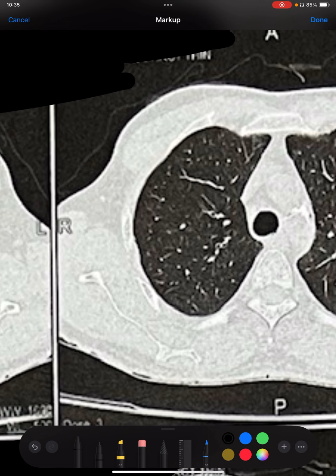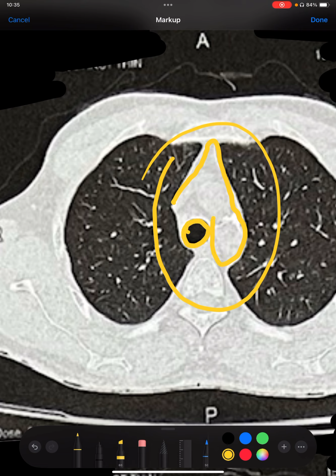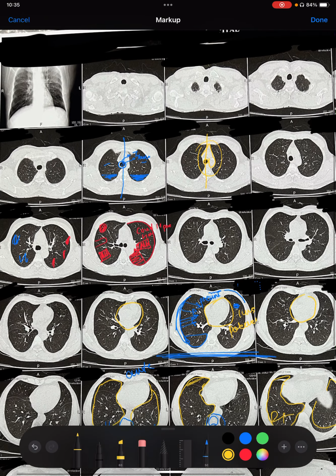What you need to see also is that there should not be any pulling or pushing of the mediastinal structure, as this portion is of mediastinum. This is all heart portion. This is trachea, and the trachea is exactly almost in the center, slightly toward the right, which is a normal variant. So if you see, trachea is in the center. It is divided into two main bronchi, now it is going towards both the lungs. And these mediastinal structures are almost in the center only. So they are not pulled or pushed anywhere.